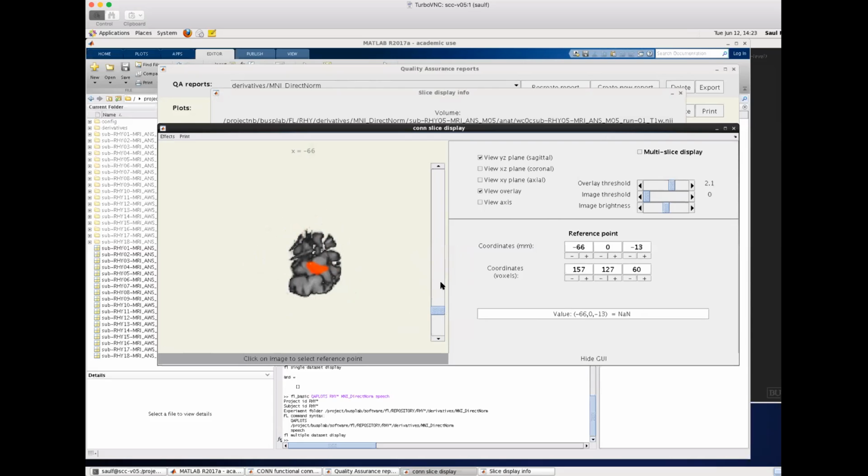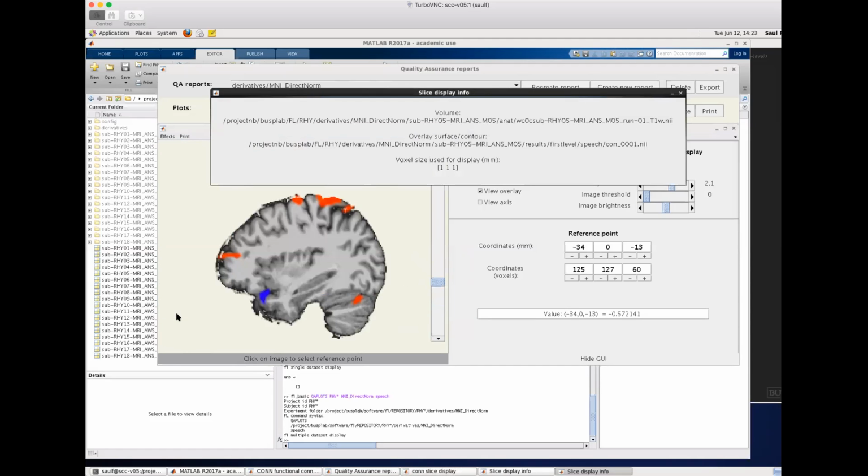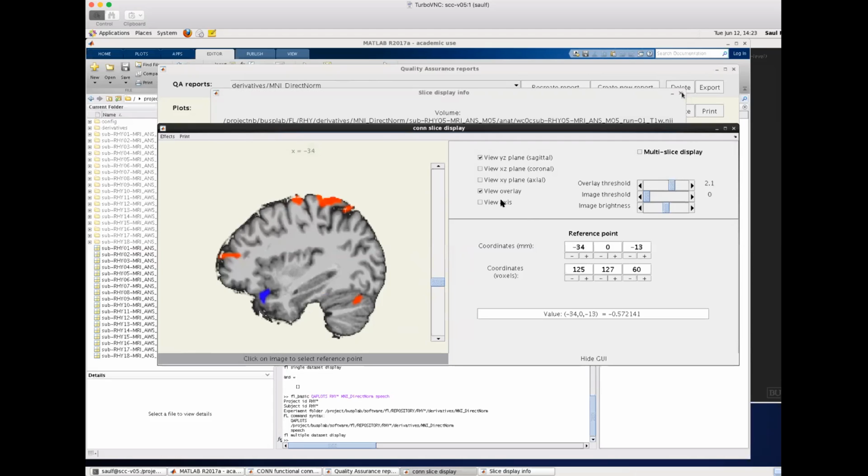You can actually check in there: if you go to effects in the upper left menu, where it says effect info, it will tell you which file they're extracted from. So it's con_0001, so that's a contrast volume, right? Okay. That looks pretty good.